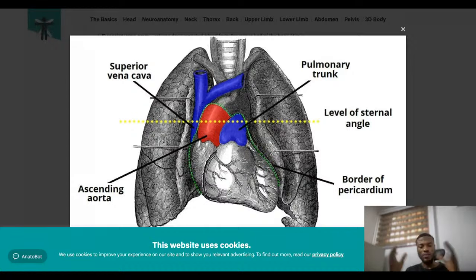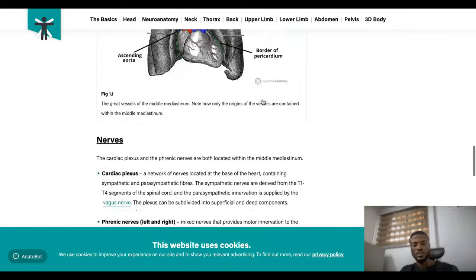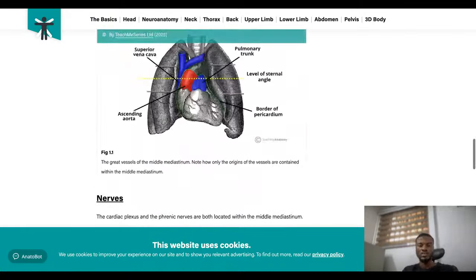And then we have the ribs, okay? And then all the other structures of the thoracic wall. But these are the ones that we pay much closer attention to. When you get to level 400 or 300, you are doing your pattern recognition. You see that you do a lot of things about the chest.